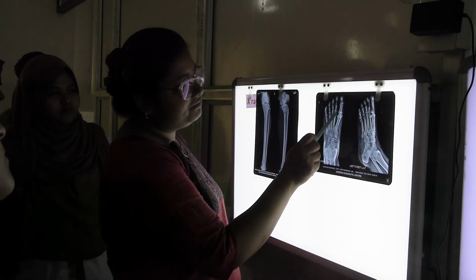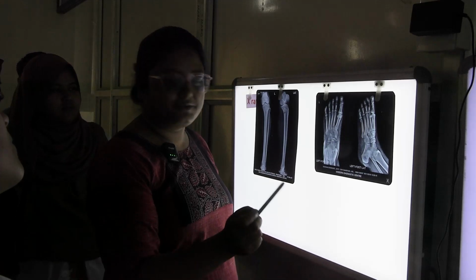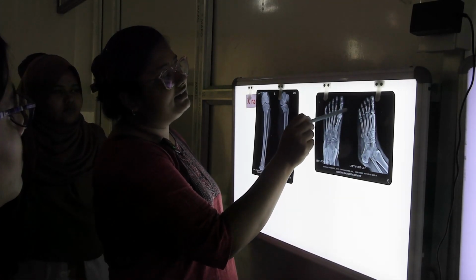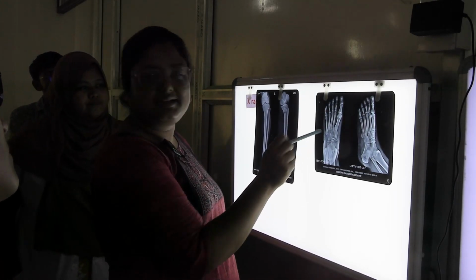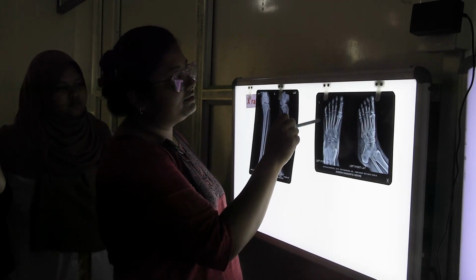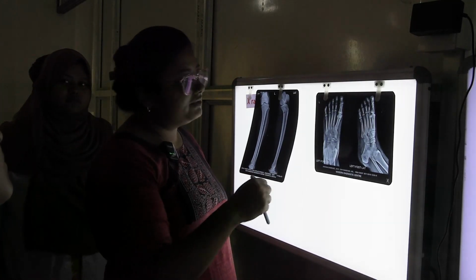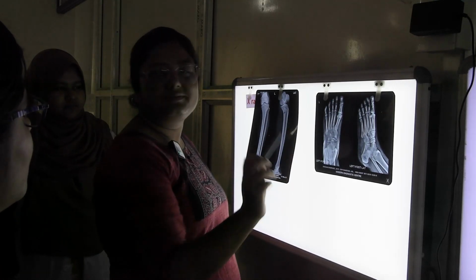Below the head of the first metatarsal are the two sesamoid bones. The heads of the metatarsals are articulating with the phalanges: 2 phalanges for the great toe and 3 each for the rest of the toes. Proximal and distal phalanx for the great toe, proximal, middle and distal phalanx for the rest of the toes.